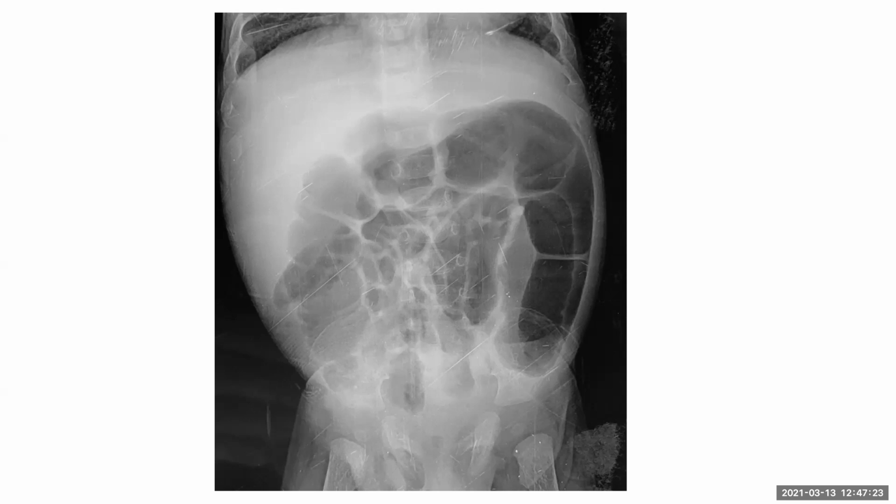So overall, summarizing my findings, there are multiple dilated bowel loops. I am worried about bowel obstruction in a neonate, and this could be due to Hirschsprung disease. I cannot appreciate any other obvious abnormality. So I would urgently convey my findings to the referring physician, and the patient needs a referral to the pediatrician, as well as any other views if available, and a lower GI barium study to further confirm my findings.